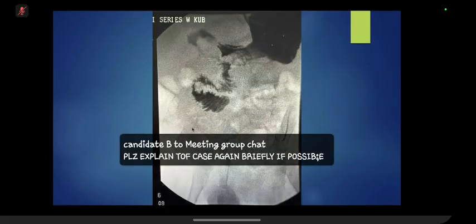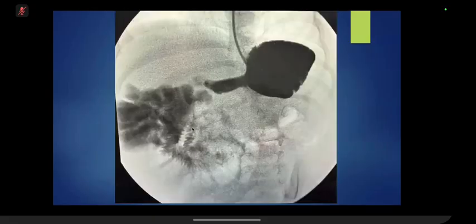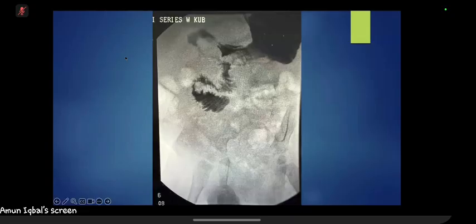The bowel loops are basically immature. When we deal with babies, their bowel is a little bit immature, so it takes some time for them to get distended when we are giving the contrast. Once they get distended, the contrast passage through the rest of the bowel is also shown in the films. So in order not to make a hurried diagnosis that there is a stricture, try to think about the scenario that it's a baby, the bowel might be immature, and on the subsequent films we saw that the part of narrowing is also getting opacified by contrast.